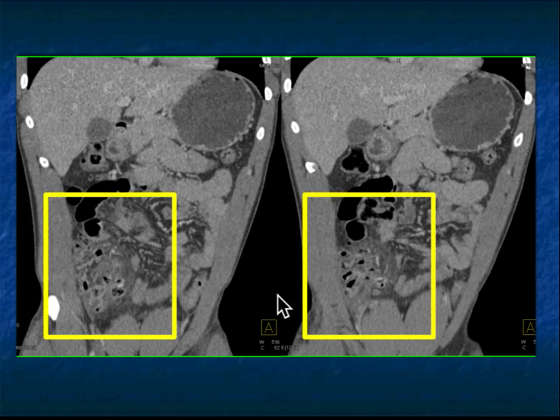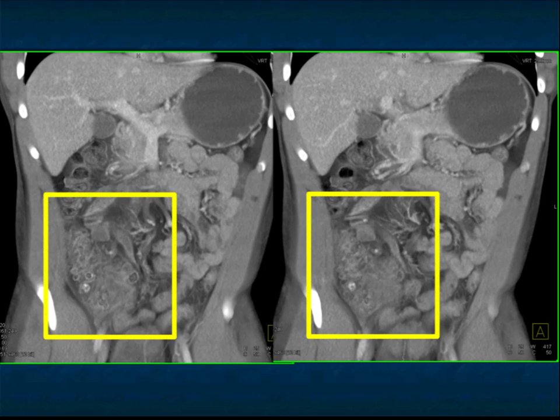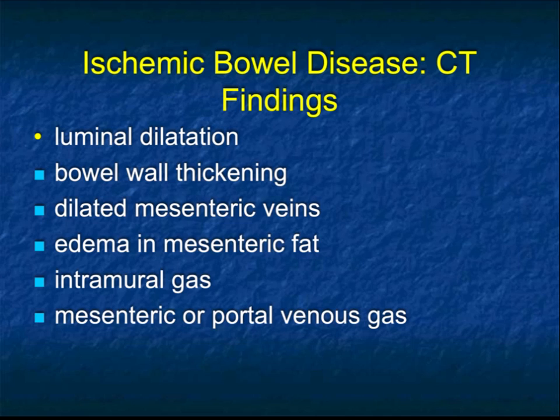And if you think about how this looks, it looks very similar to the jejunal appearance. And again, look at those little air bubbles. That appearance, you have to etch that in your mind. So the next time you see it, which is not going to be today probably, you will recognize it. So just a beautiful example of ileal diverticulitis. Again, ileal and jejunal are the two most common areas to get this process.